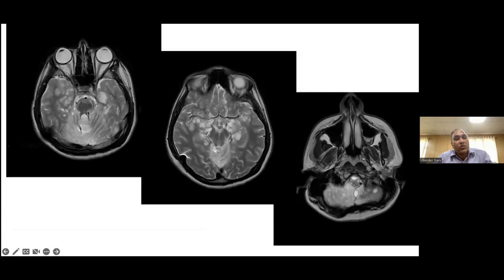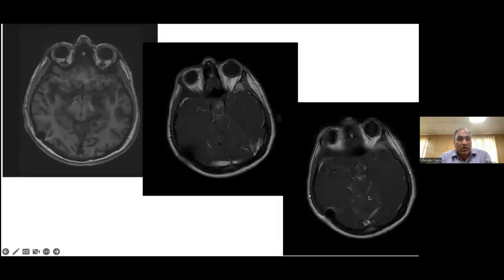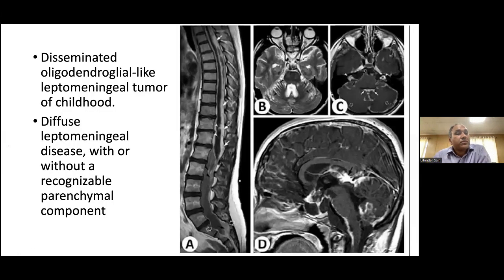They can show calcification, a lot of susceptibility on MRI, and a lot of cysts. This is a very distinct imaging appearance. Hardly anything else shows this kind of imaging appearance. It's a case of diffuse leptomeningeal glioneuronal tumor. There's hardly any treatment. They can survive for a pretty long time. I think some centers offer radiation for them, but we should not think of them as cysticercosis. They are actually a tumor. They can have spinal cord involvement, like for example this particular case, and they can have a meningeal spread as well.